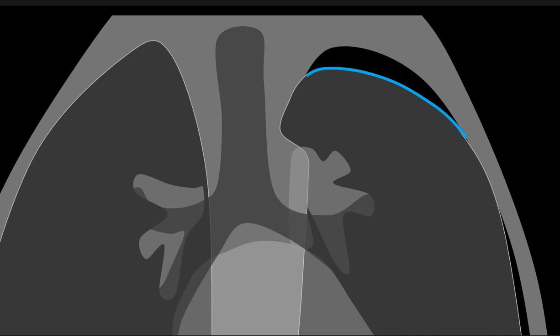So that's a key finding, especially in the setting of an apical upright pneumothorax here. So we want to see that white line, and I want to point out that that line doesn't run off the side of the patient in that direction, or off the side that way; it's sloping, curving with the contour of the lung at the apex there.